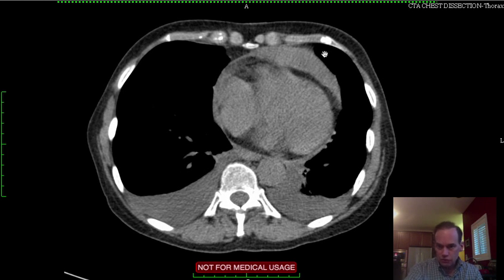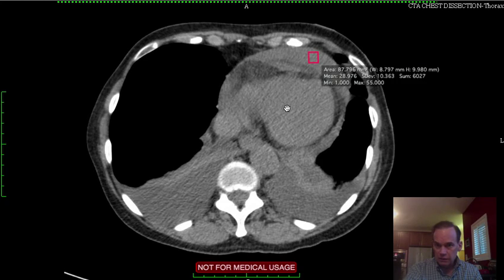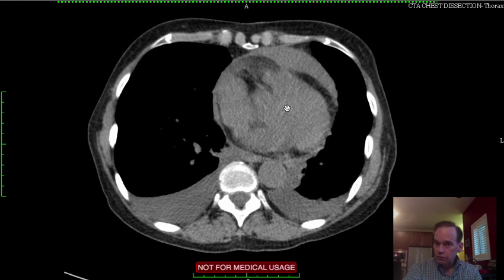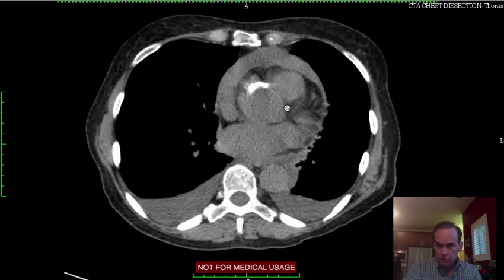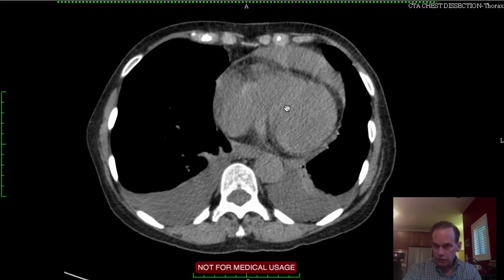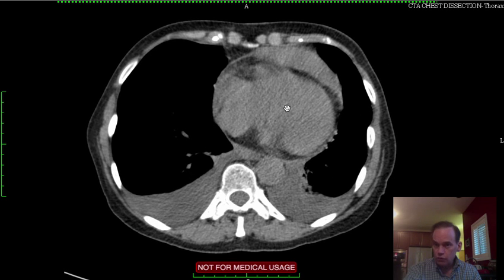So this looks like a heart in systole, contracted in other words, whereas it may well be in diastole during these images and just appears like it's contracted because this external hemorrhage, this pericardial hematoma, is compressing the heart.